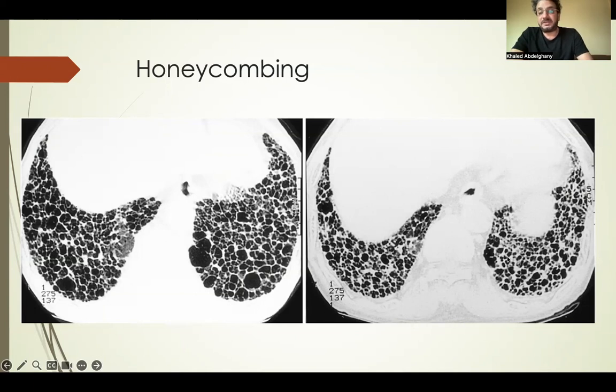Interlobular septal thickening is not a sign of fibrosis unless it is irregular reticulation. But interlobular septal thickening is not a fibrotic feature per se. These are honeycombing cysts, thick-walled, air-filled, stacked along the costal margin, and they are almost rounded, not bounding the pulmonary lobules.